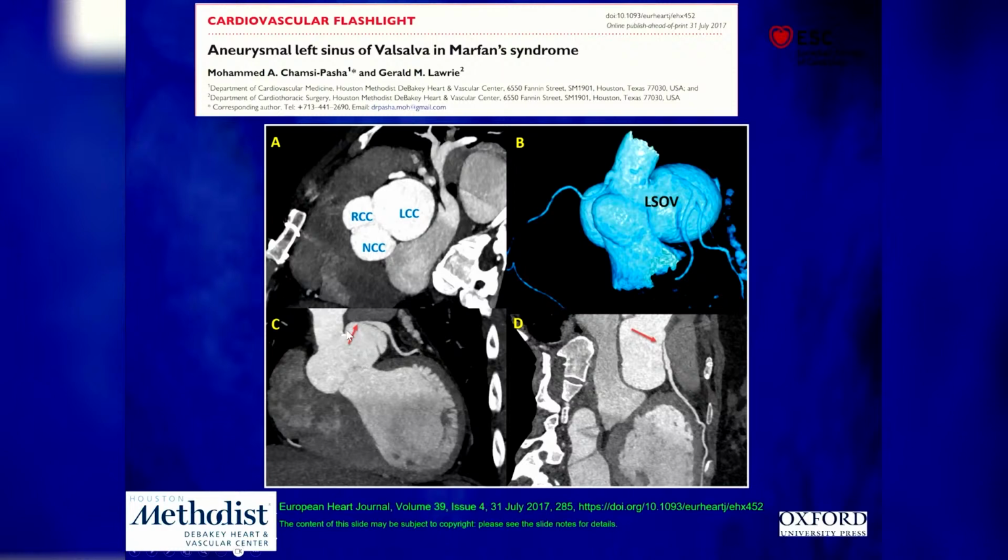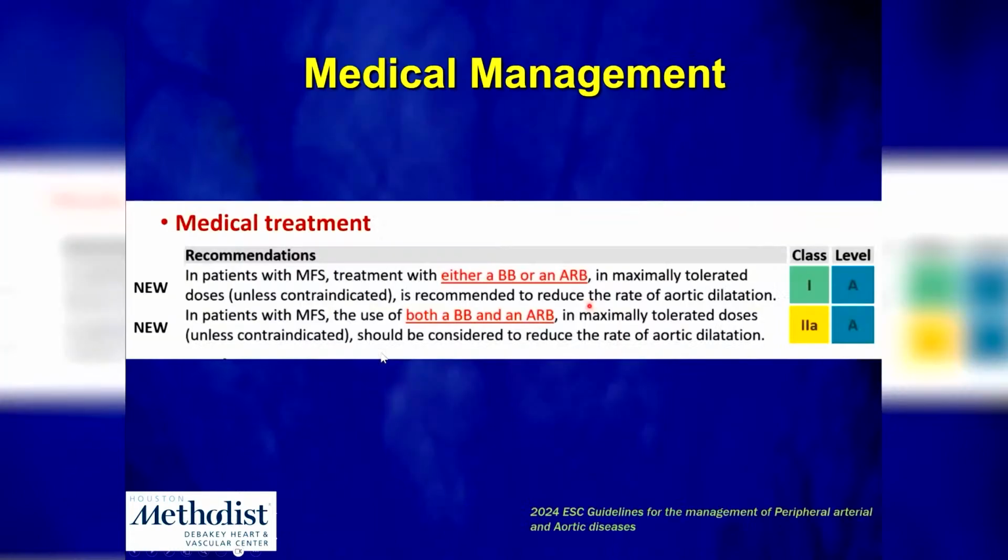Prior to that, the patient did have a DeBakey type 1 dissection. As you can see here, the ascending aorta has already been grafted in this patient with a residual dissection plane at the base of that left coronary cusp.